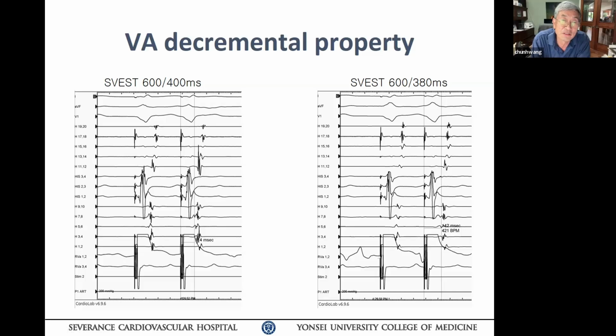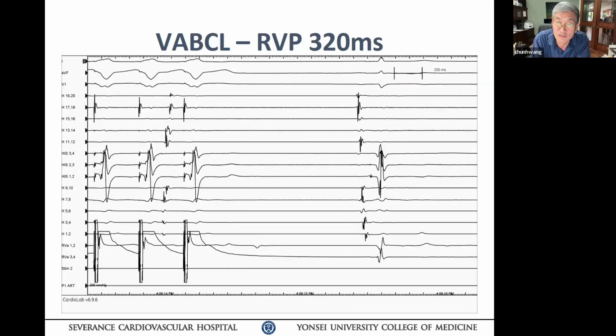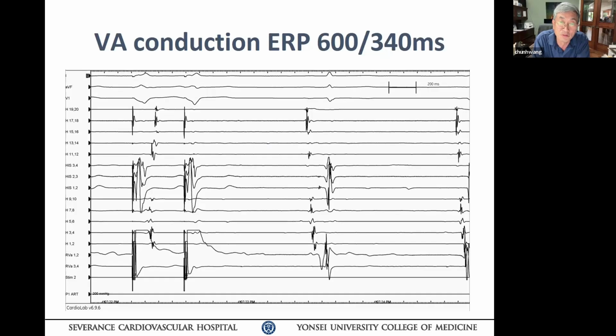There's also, if you go back one slide, I think you're pacing ventricular pacing faster somewhere. I just can't remember now, before you block, I think. And you can see that the CS and His activation time change, okay? That already suggests that there might be a pathway hanging out in the CS. If this was all the way concentric His bundle activation, there's no reason to change HRA activation or His bundle activation, the whole nine yards. So I keep telling you guys, watch the His EGM, okay? All right, keep going. Go forward. I'm just trying to make a comment for you. Keep going.